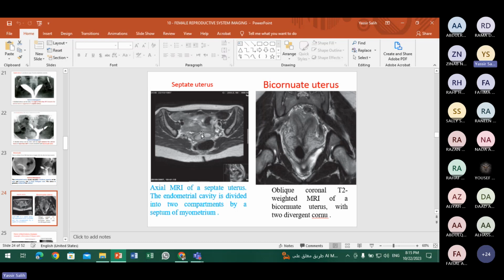Is it axial like this? No. Look at this one. Is it axial? This one? Frontal, or yes, they call it coronal. Yes, that means coronal. It is as if you are looking from the front, assuming that you are looking from the front, you know this is coronal.